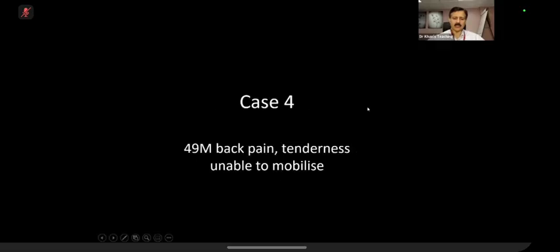Okay, you've got another case, so let's crack on. What is this? Okay.